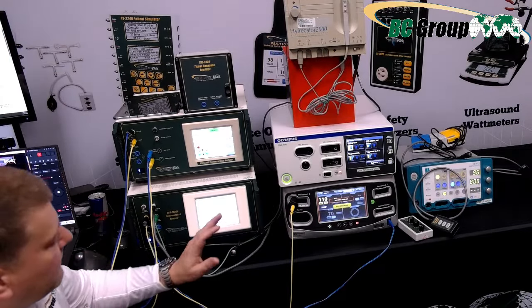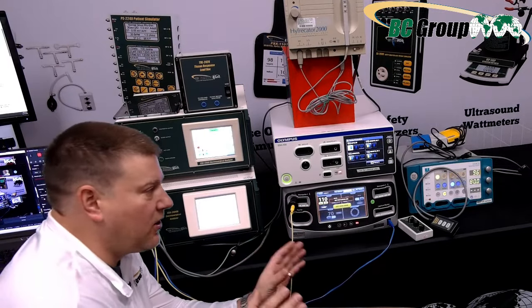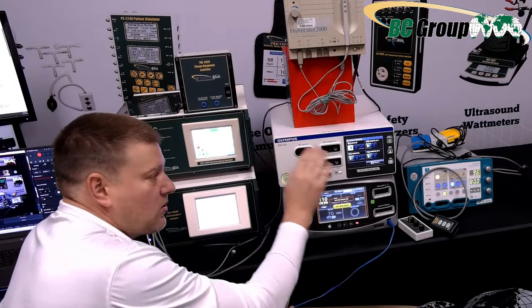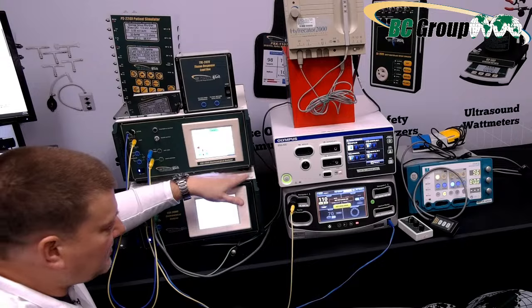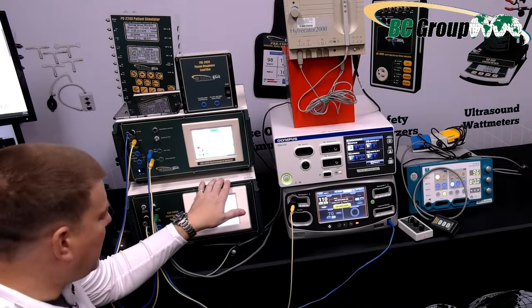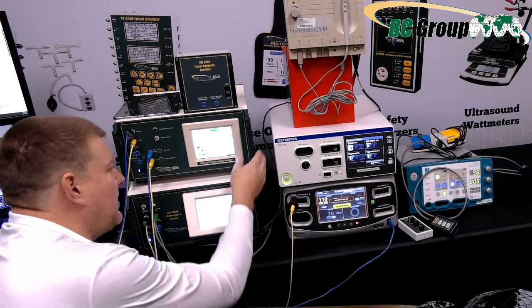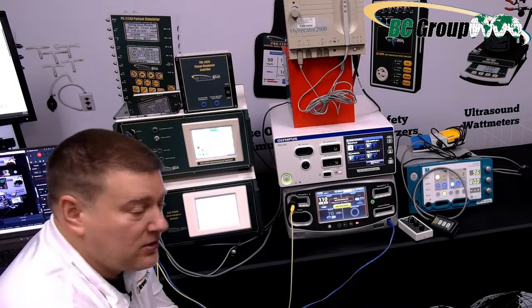Okay. So first thing I want you to be aware of is that there is a different technology in ESUs. Some people think that they're all the same. There's many, many ESUs that can't be handled by many, many ESU analyzers because they have new features or they're too high of a frequency. But as long as you set it up correctly and you use the correct test equipment, you'll get a reliable and repeatable result, okay? The 2400H, it's obviously my favorite for a reason because it saves me a lot of time. But if you are on the move and you are going from site to site, the 2350 up here is phenomenal. The pictographs that show you what you have to do with each step.